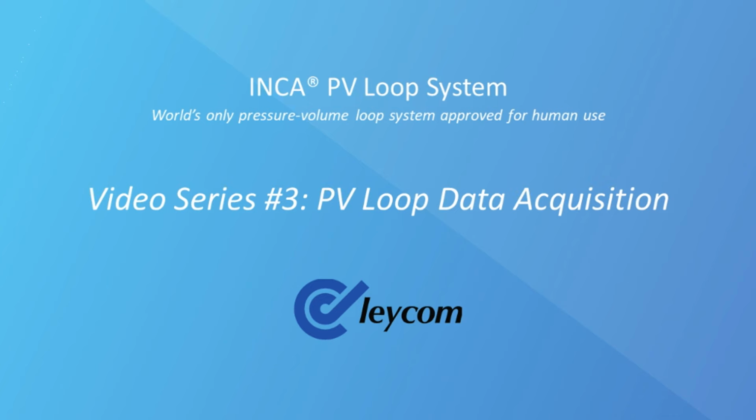Welcome to video series number 3, PV Loop Data Acquisition. In this video, we'll review some of the options for acquiring PV Loop data using Leycom's ConductNT software.